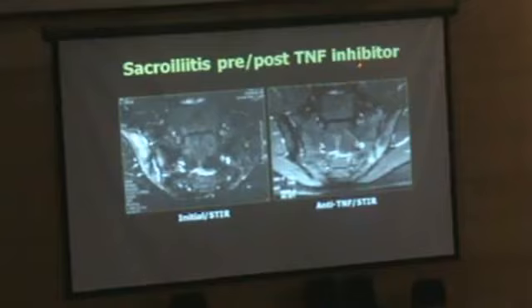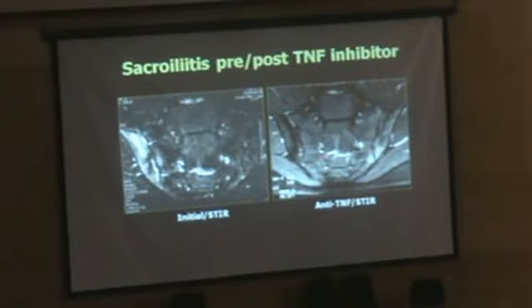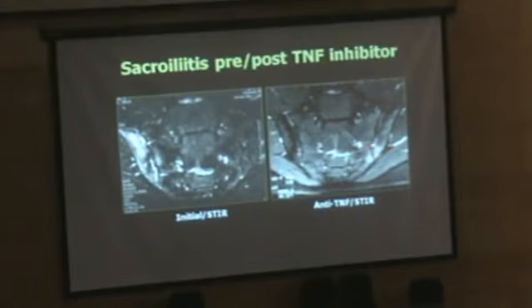So after he was treated with tumor necrosis factor inhibitor, which we call as well the anti-TNF, you can see that this huge right sacroiliitis is basically gone. We don't have a lot of inflammation anymore, but now we have small inflammation in the inferior aspect of the left sacroiliac joint at follow-up.